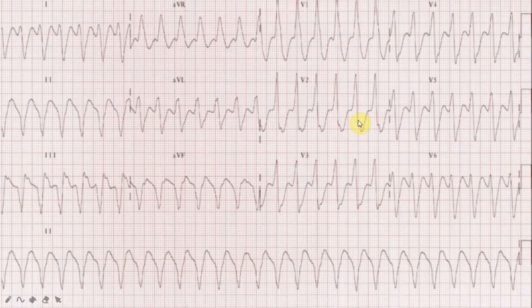As the second step of the Brugada criteria is fulfilled in this ECG, we do not need to go to the next steps. Now, to compile all this information together, I am of the impression that the patient has monomorphic VT. I am very concerned about this patient. My immediate action would be to assess the hemodynamic stability of the patient. Then, I'll give appropriate treatment such as DC cardioversion under some procedural sedation.